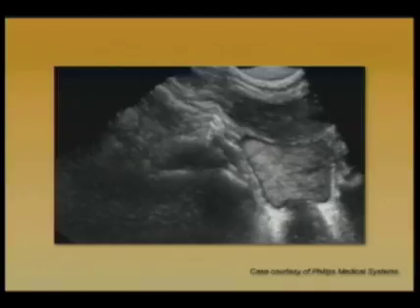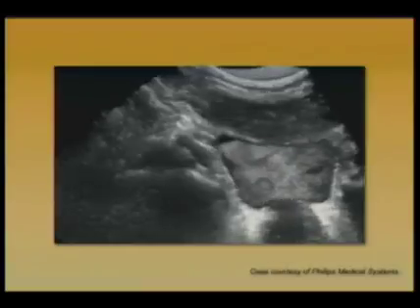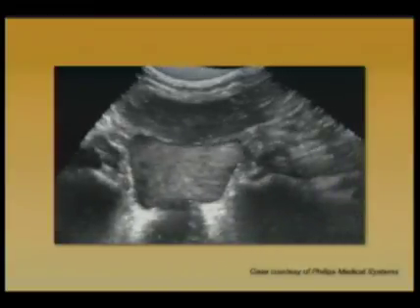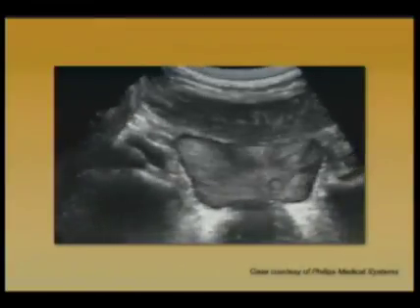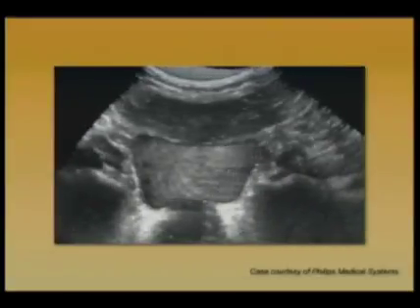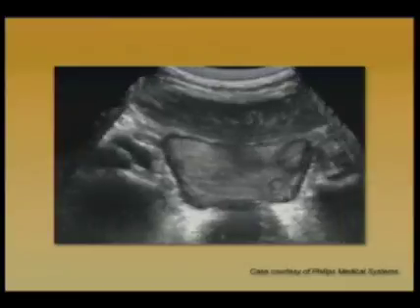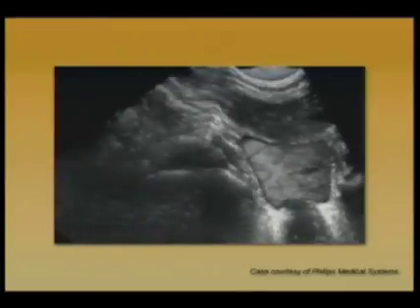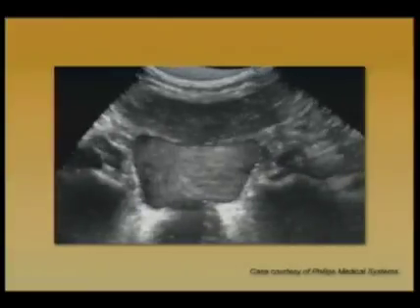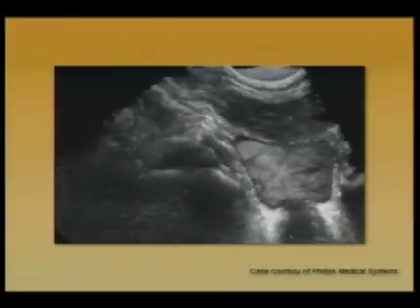In this case, the original data for which was loaned to me by Philips Medical Systems, I did the 3D reconstruction. As I begin to show the 3D animation of this bladder, you can see over in the corner there are several protuberances that are extending into the bladder lumen, and these are transitional cell lesions that were confirmed cystoscopically. And again, we can now see this in 3 dimensions so clearly because they're surrounded by urine, which provides great contrast.